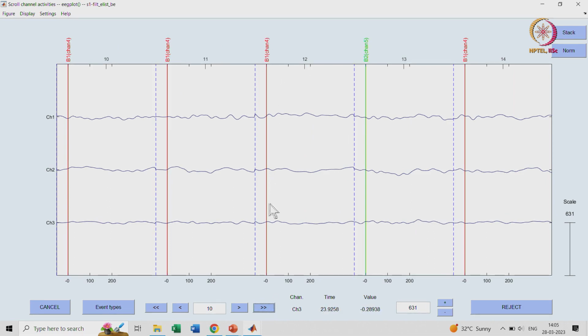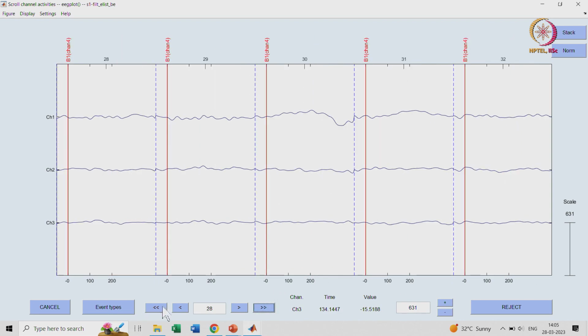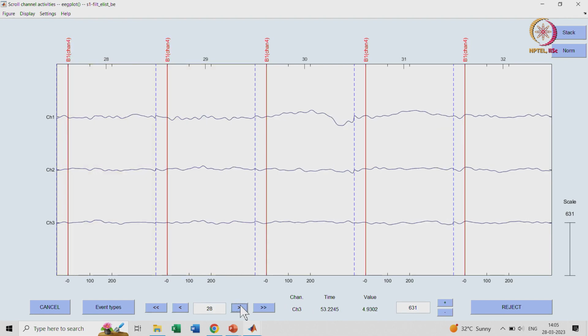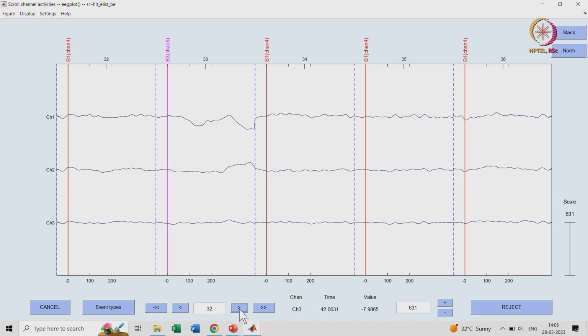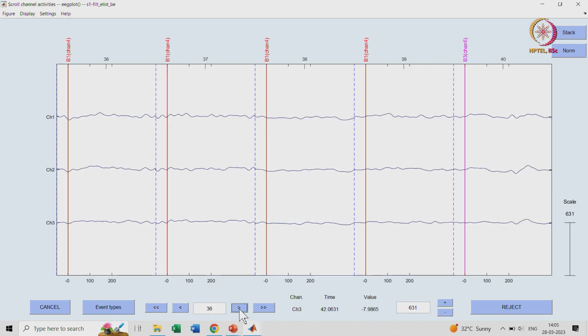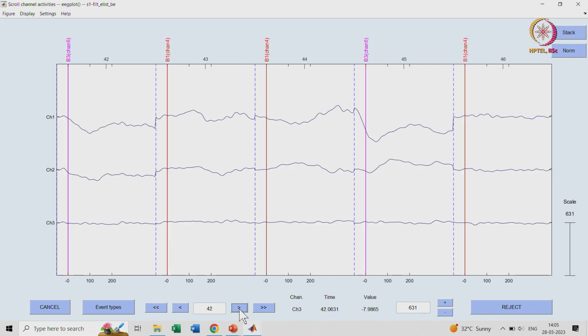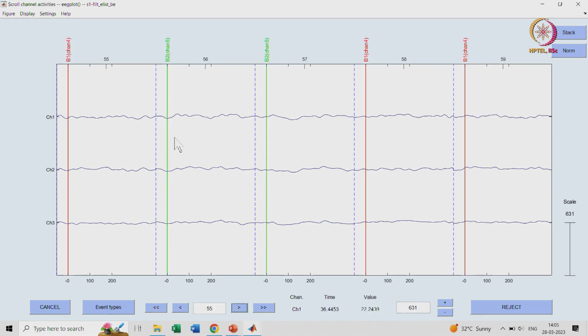You can see for bin 4 also it has epoched, for channel 4, channel 5, everything it has been equally placed and kept. Okay, there was one instance of channel 3 as well. Yeah, this again I will show it to you. B1 is there, this pink one is B3, right? And similarly B2 we have seen before. So in the same way all bins have been epoched as per the given time range. You can verify it throughout the recording, also bin 2, right?